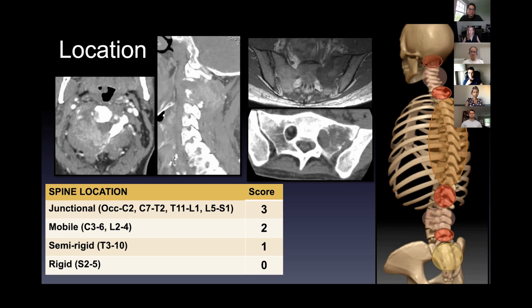JR, what do you think about surgical strategy for this? Yeah, so assuming the patient's a good surgical candidate, taking into account frailty scores, KPS, the patient has a good oncologic prognosis, and assuming that this tumor is radio resistant and chemotherapy resistant, and you ultimately decide for surgery, the main things here are that there's essentially complete erosion of the 2-3 facets posteriorly. There's erosion, I think in the axials maybe even at C1. Does it involve the vert on the right?